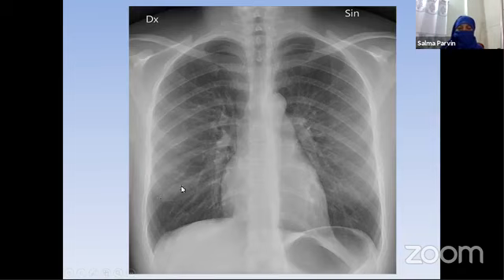You can read from the anterior aspect, and also you can go through the posterior aspect, as this is the posterior end of the first rib, this is the second, third, fourth, fifth, sixth, seventh, and so on. So you can ask, should I count the position from the anterior aspects of the ribs or the posterior aspect? What should we go for?